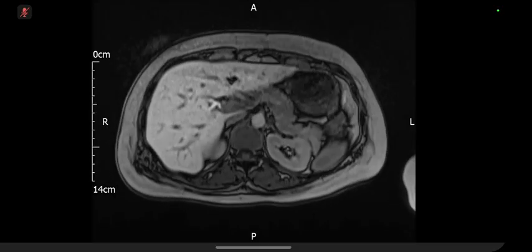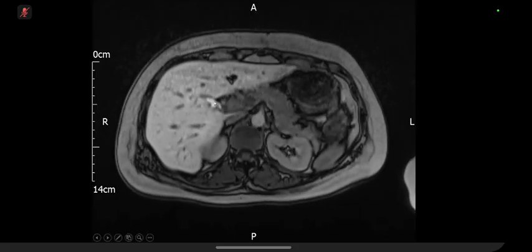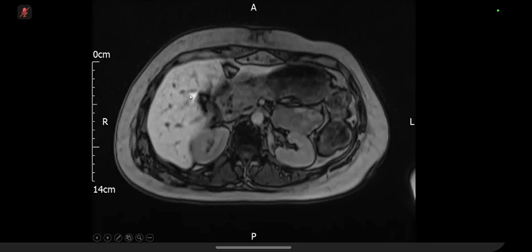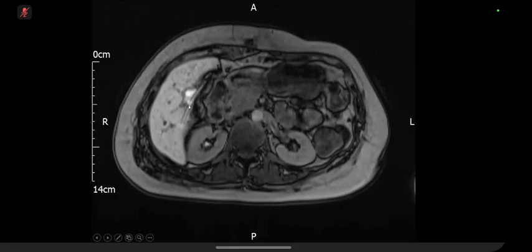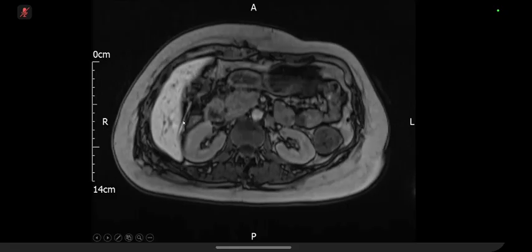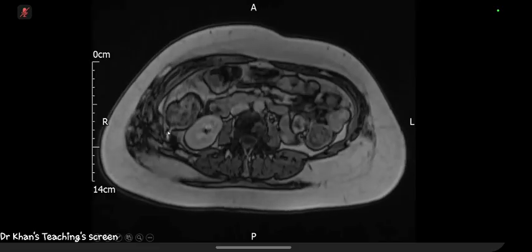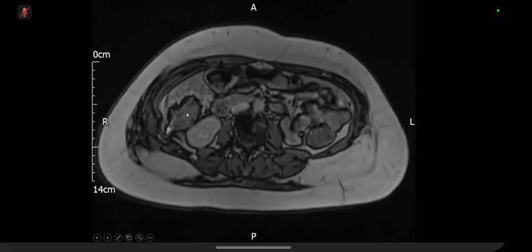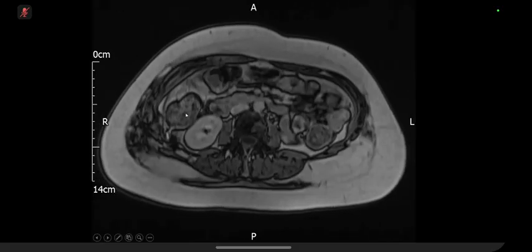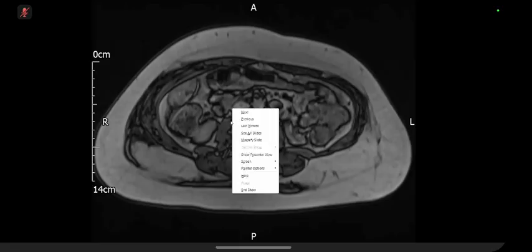do you see this? So this is the right hepatic duct. And now do you see how contrast has concentrated here? Actually, contrast is now going into the drain. You can see it here, right? Convinced? But I think out of these 15, I got results in about 4 or so. But still, there is a model, we can do it.